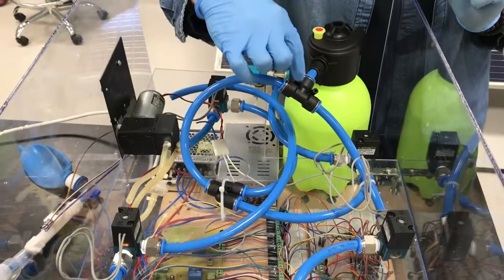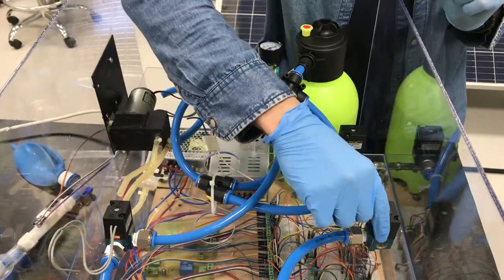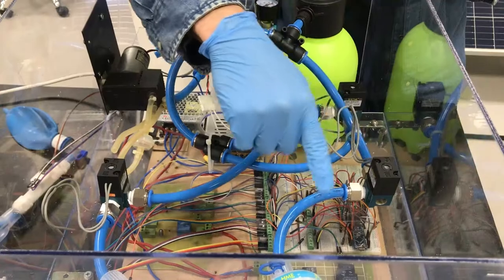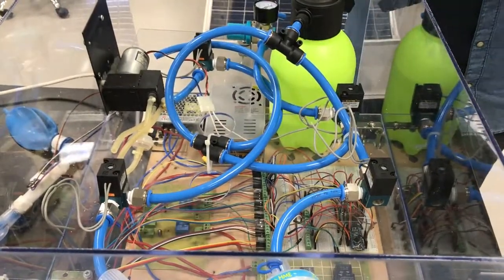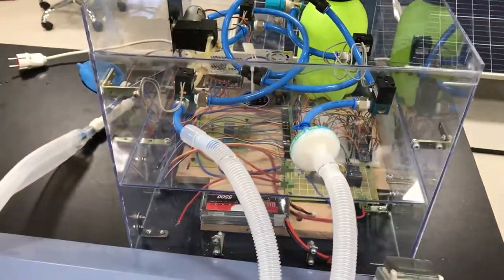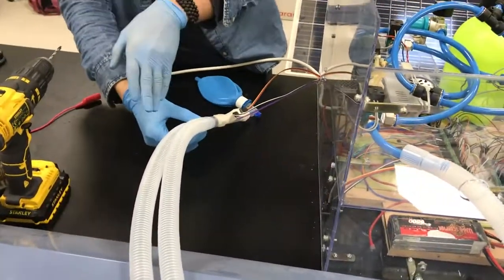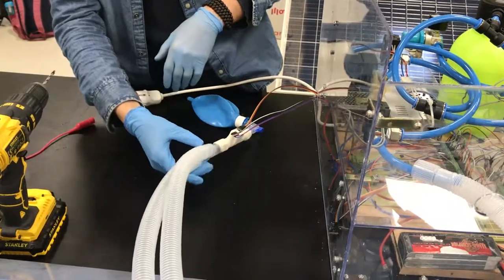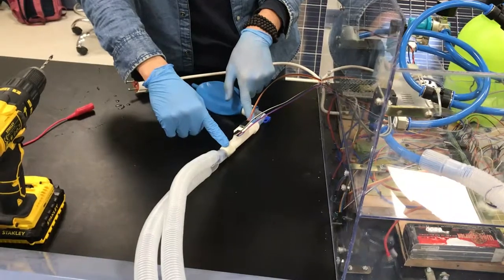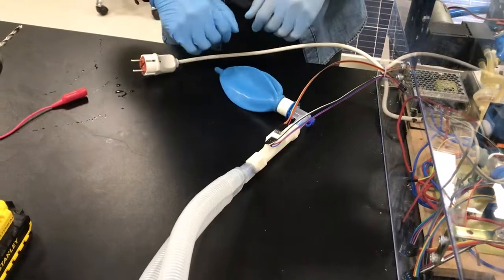You have then a path going to this valve here, which is the inspiratory valve, controlling the pressure going into the lungs and the time you need to reach the assigned pressure. So this is the way to the lung. If you go with the path here, you will find this is the Y piece for the inspiratory and the expiratory paths together. And both of them are going into this block here, which is the airflow sensor, oxygen sensor and pressure sensor before you go to the lungs.